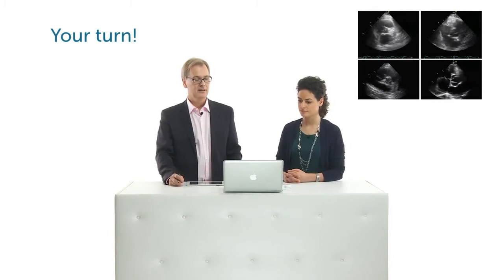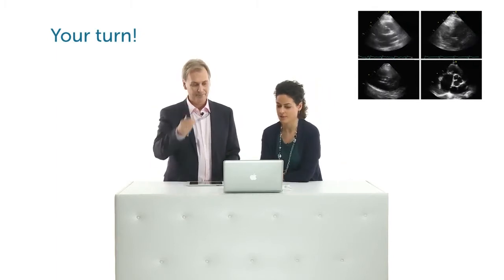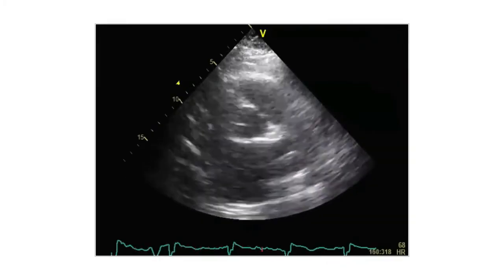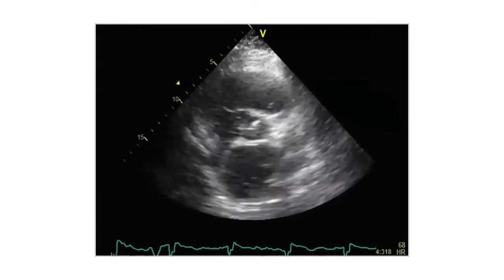This is aortic stenosis. Take a look at that because that's what you'll be searching for in your patients. And now it's your turn. We have 4 examples. Anna, can you take over? Yeah, we will show them one by one and try to detect which one has stenosis.